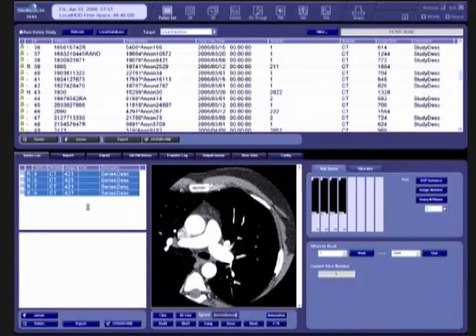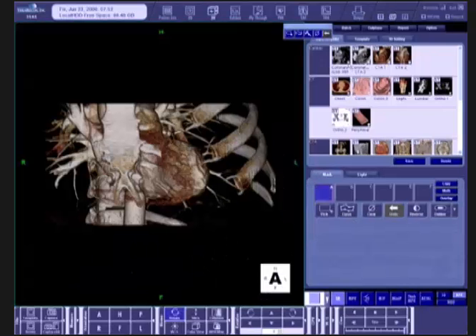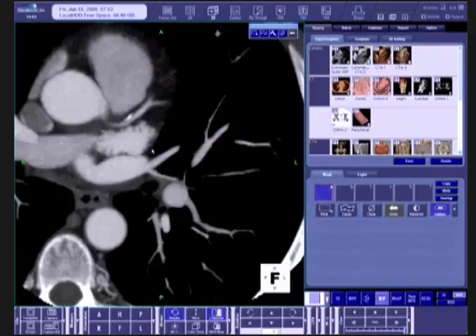Once these images are loaded, I begin by using the convenient templates that are positioned in the upper panel here. I tend to use 3 templates, the slab MIP and then 2 volume rendering techniques. I first start out by looking at the coronaries in a thin slab MIP.